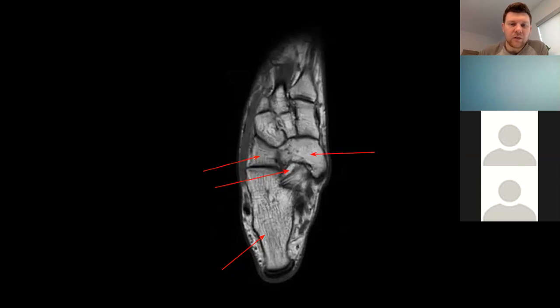You're close. Let me get my mouse back here. It keeps disappearing on me. So this, what's the structure running right here? Is that the spring ligament? Yeah, there's the spring ligament. So what does the spring ligament support? What bone would be right underneath here?